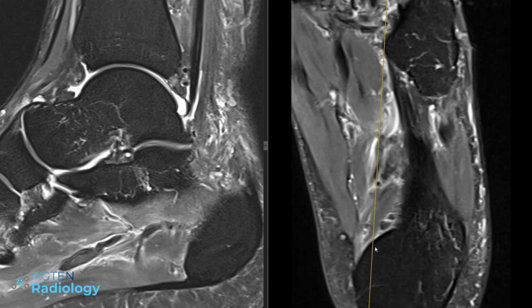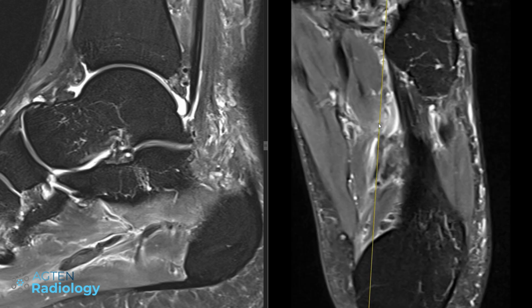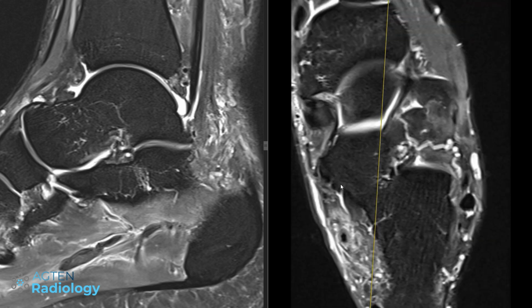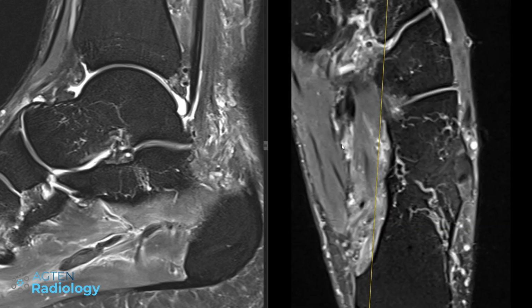And so what is the medial one doing? I said the lateral one, so this is the lateral one, and the medial one would be here. This is the tendon, and we try to find something here, not quite obvious. Here it's going down, it seems to be enough.